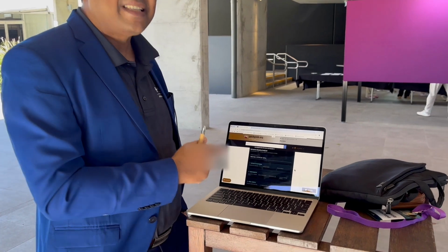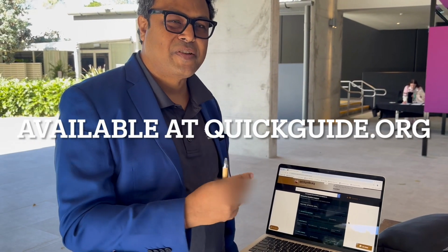You choose an IOL implant in a patient, you did the best of IOL power calculation, but you still land up with some refractive surprise, and you might be thinking what may have gone wrong in that case. So this refractive surprise analyzer actually helps you to understand step by step what could have gone wrong in that case. And I'm going to demonstrate that to you.